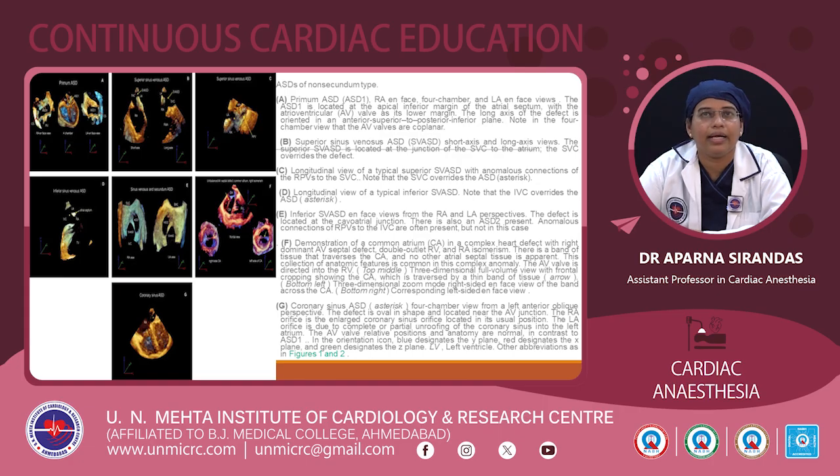this case. And F figure, you can see demonstration of a common atrium in a complex heart defect with right dominant atrioventricular septal defect, DORV, and RA isomerism. There is a band of tissue that traverses the common atrium and no other atrial septal tissue is present. This collection of anatomical features is common in this complex anomaly. The AV valve is directed into the RV.